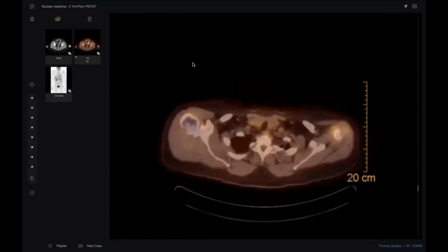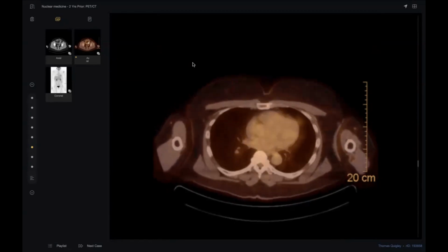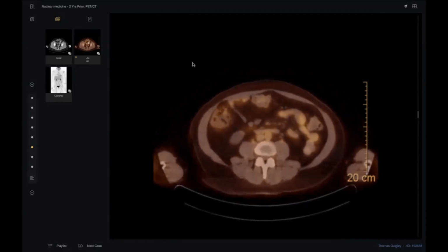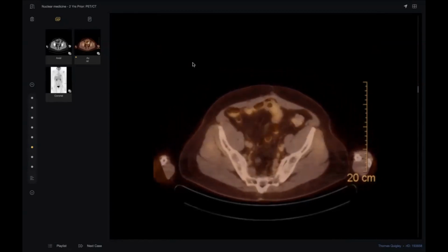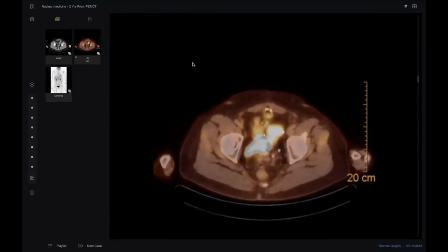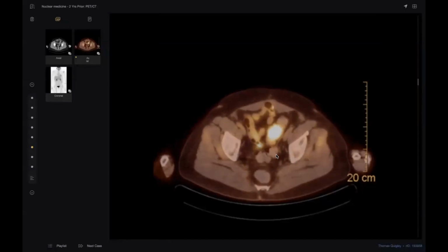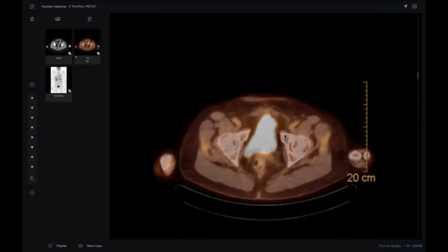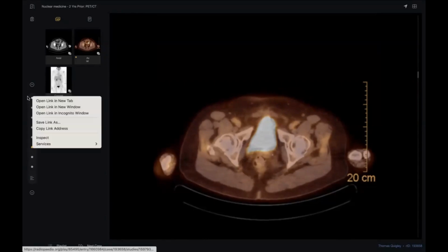It was a very long case. Thank you. By the way, this patient has a history of resection of uterine sarcoma 2 years ago. And this is a local recurrence of the uterine sarcoma, which looks like a colonic malignancy. Anyway, this is the primary, and the primary causes what you saw along the previous examination.